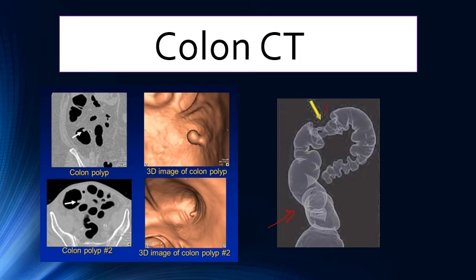We can see here there is a stricture and a mass-like lesion. Here it is distending the lumen of the colon, and through the virtual colonoscopy, we can go through the lumen and form images just like an endoscope. We can see here these are the polyps arising from the wall of this colon, and we can see here in axial image.